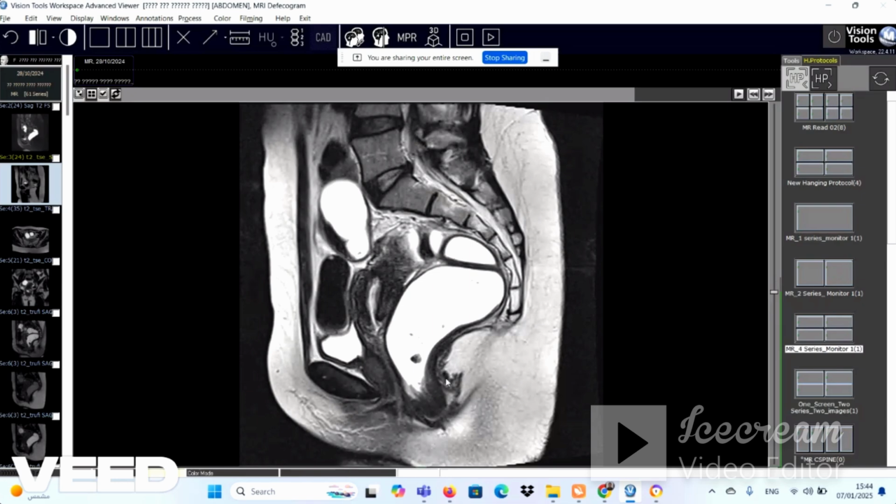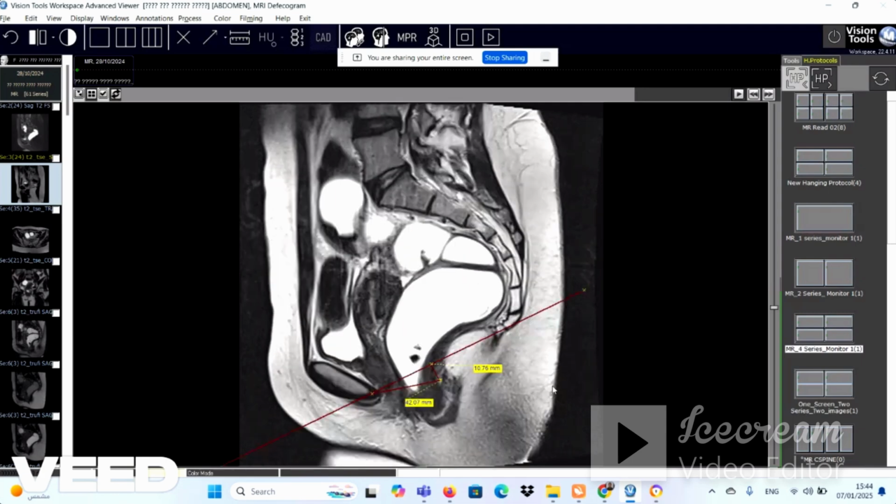This is the point or the angle of the anorectal triangle. We can start from here down to the inferior aspect of the symphysis pubis. This is called the H line. This one measures 4.2 centimeters. The normal dimension in the resting state is below 5 centimeters, so it is accepted.